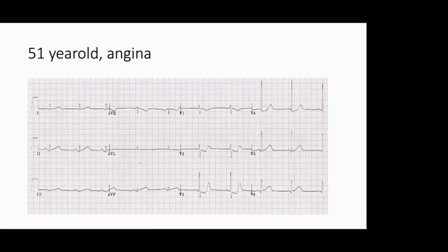This is another one you usually miss, seeing only subtle ST elevation. Prominent ST depression, usually you can miss it. So we get V7, V9 leads to see there is a posterior wall MI. The only thing is, prominent ST depression will be there with upright T. You can see prominent ST depression with upright T. If this is there, then it is posterior wall MI. This is only obtuse marginal, left circumflex occlusion.